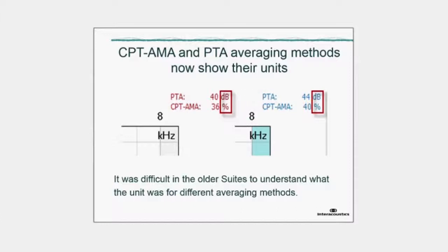The implementation of this does not require any other settings to be changed. Simply showing this averaging method will apply the correct unit.